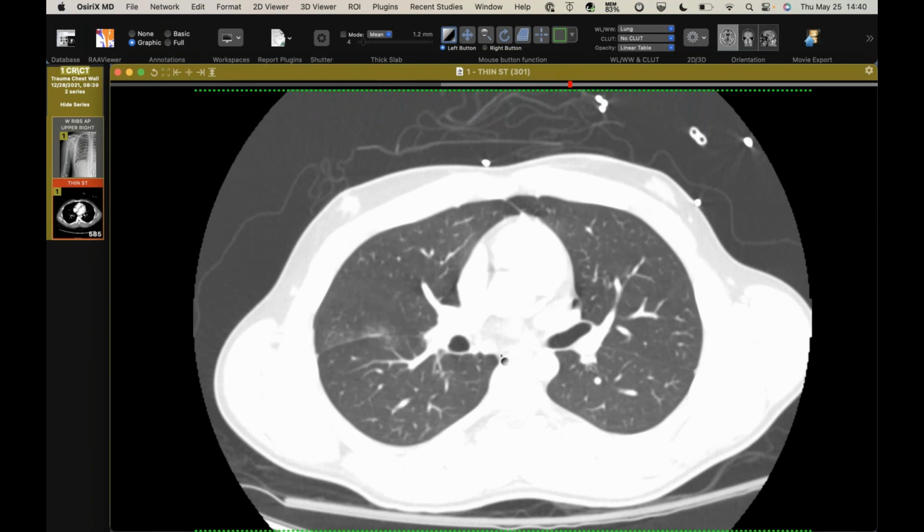Then sometimes you'll see the very long vertically oriented ones where the lung slams up into the spine and rapidly compresses and decompresses, and you get that so-called type 2 laceration from the rapid deceleration. Trauma is interesting from a mechanistic standpoint, and it can help explain injuries. It can also help you predict what you might see and make sure you don't overlook other injuries.